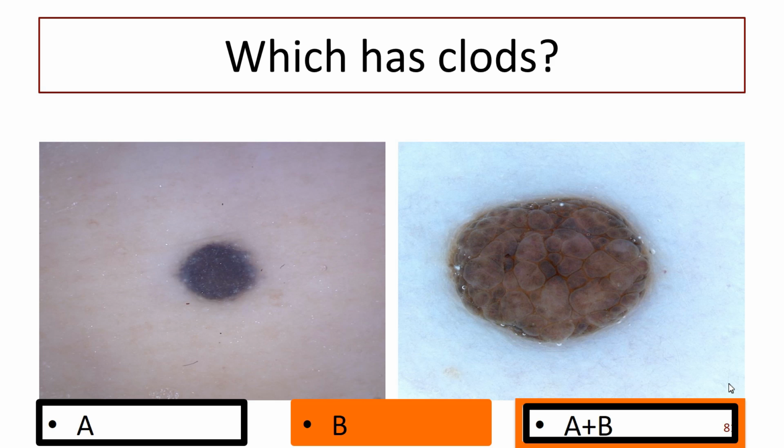So a blue nevus is fuzzy because it's deep down in the skin, so it's difficult to see. It's exactly the description: ground glass appearance. It has that blue tinge, but it's not blue all over because we have that yellow bit that comes in. Maybe you can see just a touch of that in some of the lesion. Ignore the non-coloured parts. These don't really count, but they might be white. The main structure is that ground glass, steel blue colour, blue nevus. Easy.